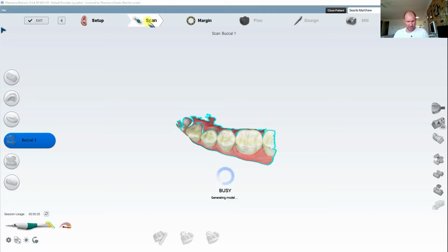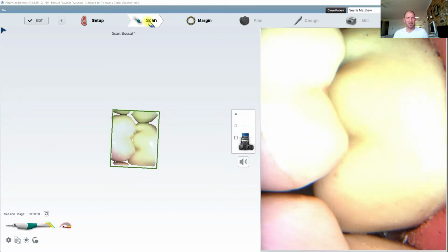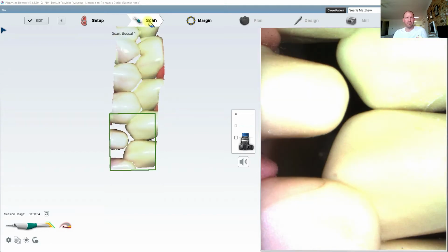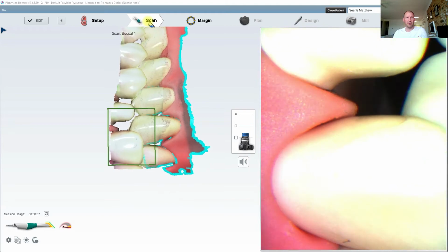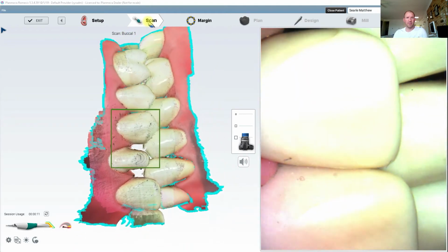So now we can go on to our next step, which is doing the bite. To do the bite, start on around about 6, because that's as far back as we went to. Start to come in easily. You can see it just dragged the lower in there, and now we can focus on the upper. Let's drag the upper in now.